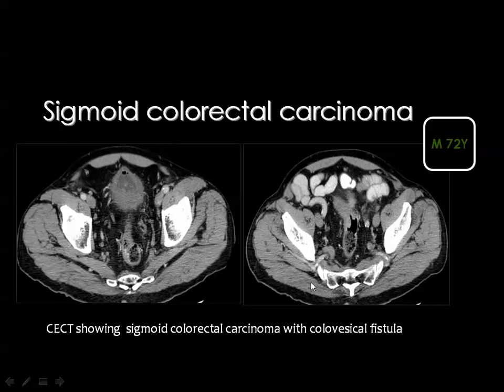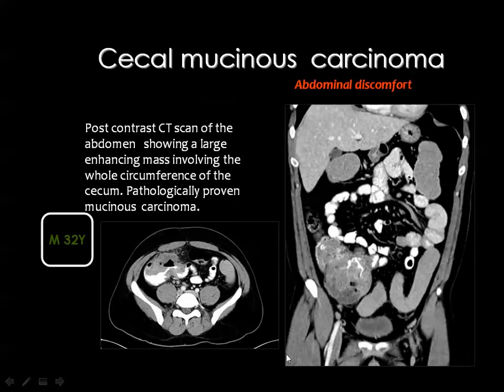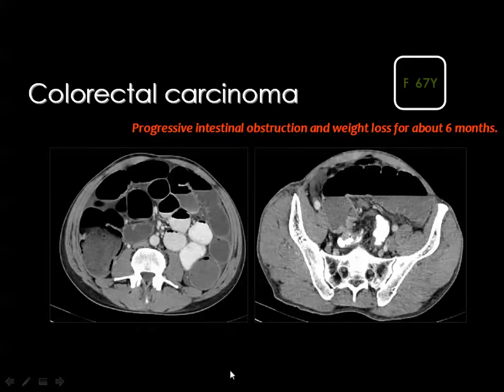And if you look carefully in this CT scan, you can see this is the sigmoid colon. If you follow the sigmoid colon, you can see progressive narrowing of the lumen and progressive mural thickening. And this is the region of the neoplasm, which represents the carcinoma, sigmoid cancer. This is an easy diagnosis of cecal carcinoma, a mass infiltrating the cecum, which is partially delineated by the orally administered gastrografin. And you can have these coronal reformatted images to see the full extent of the tumor as well.